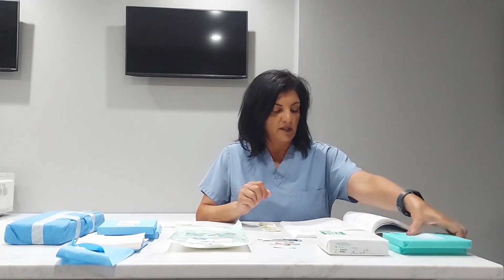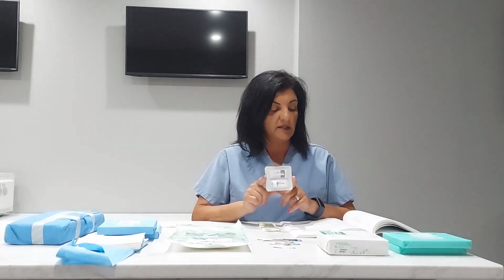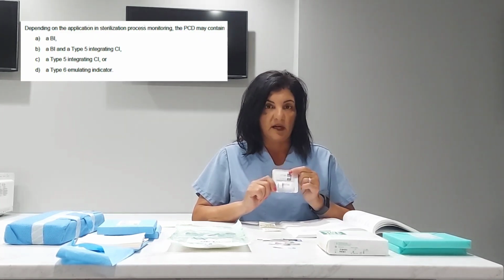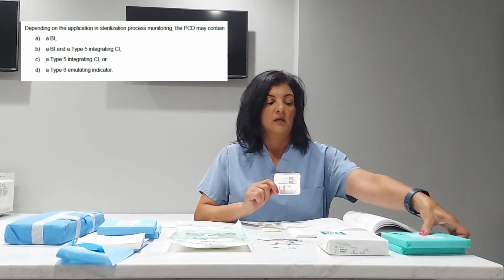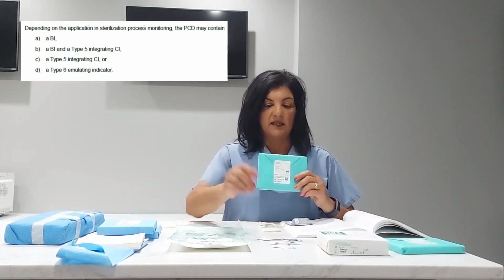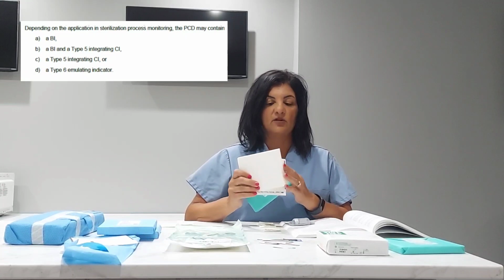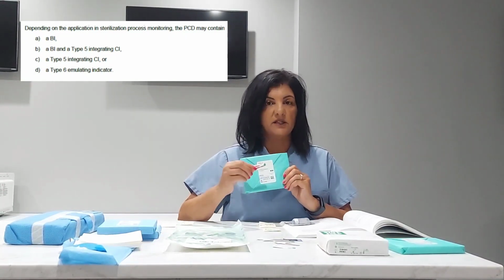The other thing I wanted to touch on, if you look at page 81, is process challenge devices, or PCDs. Typically, process challenge devices, this particular brand, can contain a BI, or a BI and a chemical indicator class 5, or like this process challenge device contains a class 5, and then it's got all the cards inside of it like your Bowie, so that it is challenging the sterilization of this indicator inside of it.